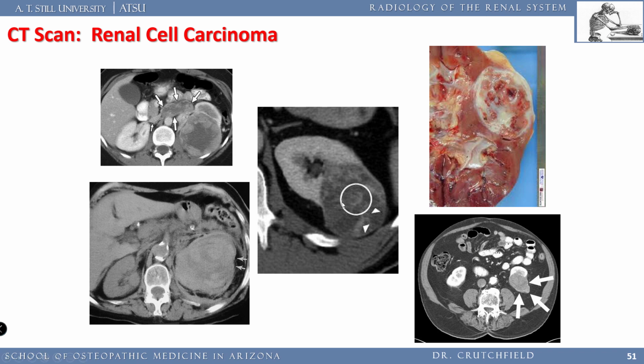So here's renal cell carcinoma. This is an evil player. Okay, on this CAT scan here, we see the kidneys. Obviously, this patient's had oral contrast and IV contrast right here because it lights up. And here's a solid mass. Okay, we don't know what that is. It's just a solid mass. Pretty good chance, though, based on the size, it's a kidney tumor.